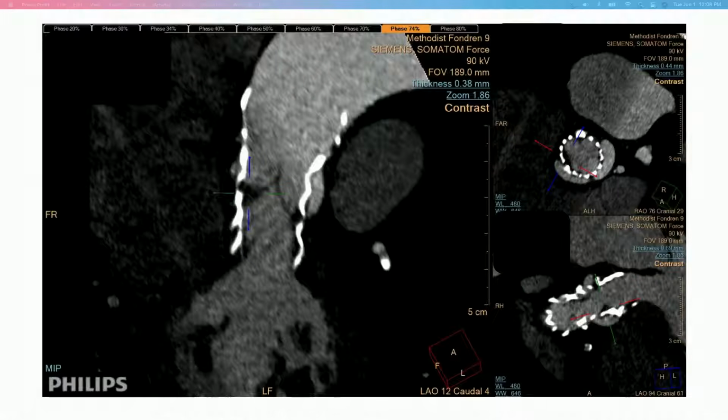These are the findings of his CT TAVR workup, which showed thickening, a meniscal-shaped thickening across the right coronary cusp of the bioprosthetic valve, involving about 50% of the leaflet, diagnostic for leaflet thrombosis and hypoattenuated leaflet thickening.